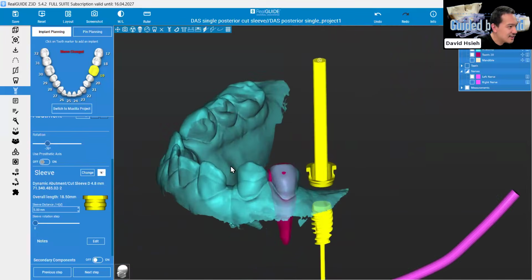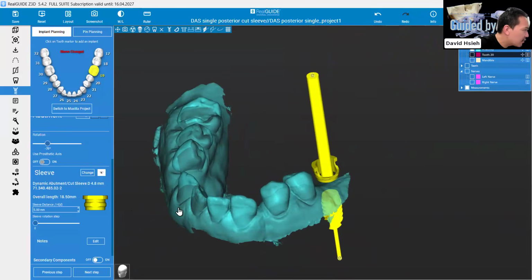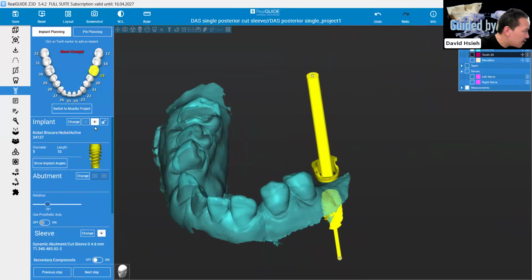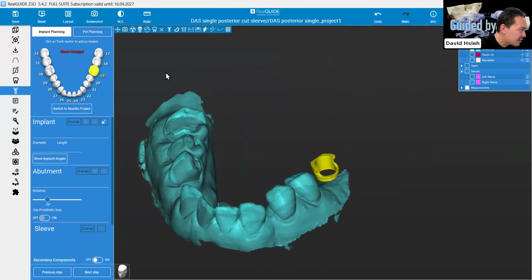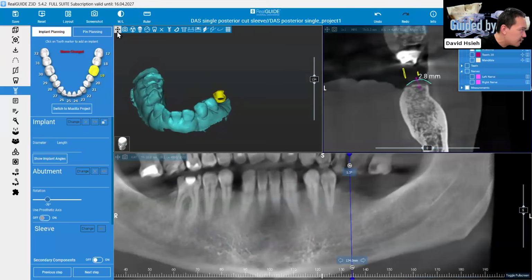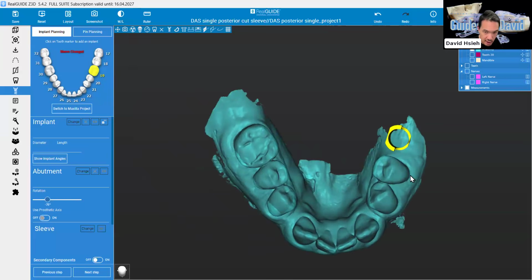All right. So everything is done here now. Let's see, we mapped the nerve, we did the merging, and we did the clinical crown, and everything we do at the end just gives us a position of a guided sleeve relative to the patient's teeth, right?